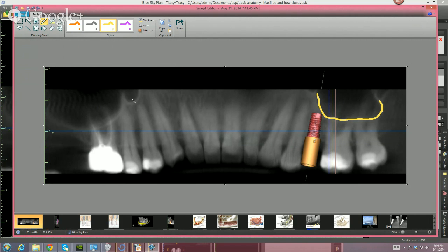And this area over here is a septum inside the sinus. Again, for anatomy and understanding of what a septum is, I suggest you go to that Dentaltown piece. I'll give you the review. But again, as far as you're concerned, what you're talking about doing is not planning an implant to go up in here unless the doctor is prepared to do a sinus lift. Okay, and here we have one that's close by. It's not touching. And that's pretty much all you have to be aware of.